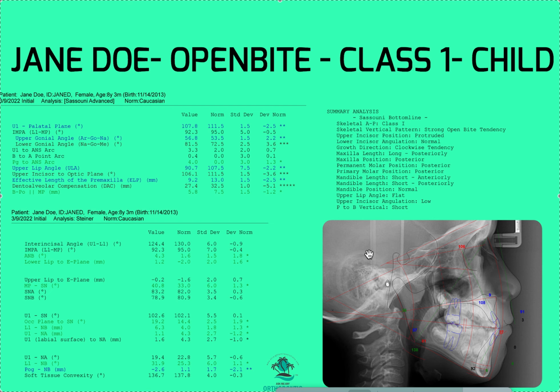So a lot of orthodontists are not going to get numbers on every case. We only get numbers when we're trying to make a decision. I mean, maybe they do, but you don't have to. But because you guys are trying to learn, you need to get numbers because you're not going to know what I see with my eye, right? So what am I looking at?